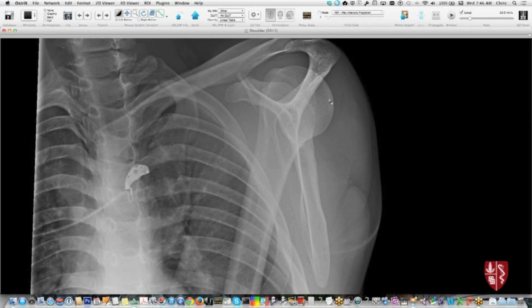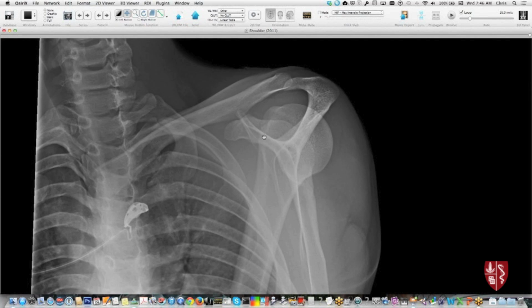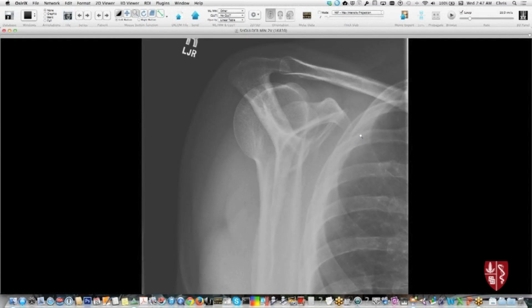Okay, here's another Y view in this patient, just showing that it's been relocated again. So humeral head superimposing over the glenoid. So here's the glenoid here, and there's this bony fragment here, which is separated by this lucency. So this patient must have dislocated, and they have this displaced bony fragment antero-inferiorly, and that's a fairly sizable fragment there. Here you can see it again. Here there's like a double density where the main glenoid's here, and then you have the Bankart component here. Sometimes they're hard to see on the Y-type view.